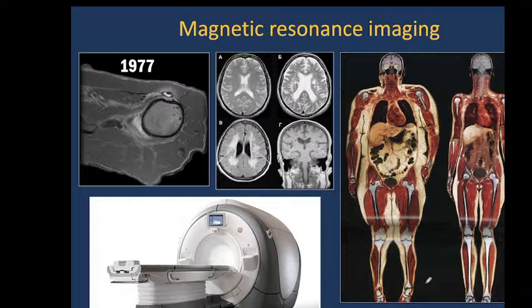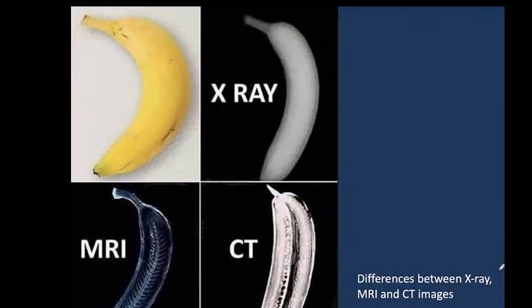As you see, MRI can produce color images of all of the body. Here is a man and here is a woman. I want to demonstrate to you different images of the three radiation methods we use in clinic.